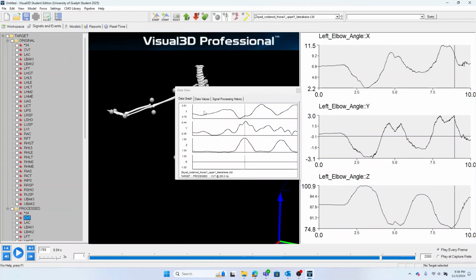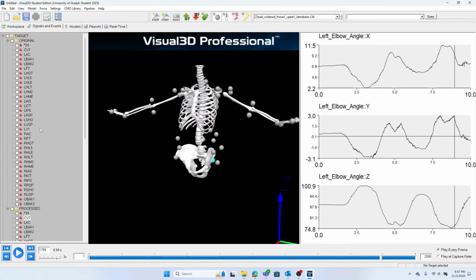You can export this and take a closer look at it all you want, but the filter was indeed applied to the data, and we can confirm by checking individual markers or checking the graphs that we plotted.